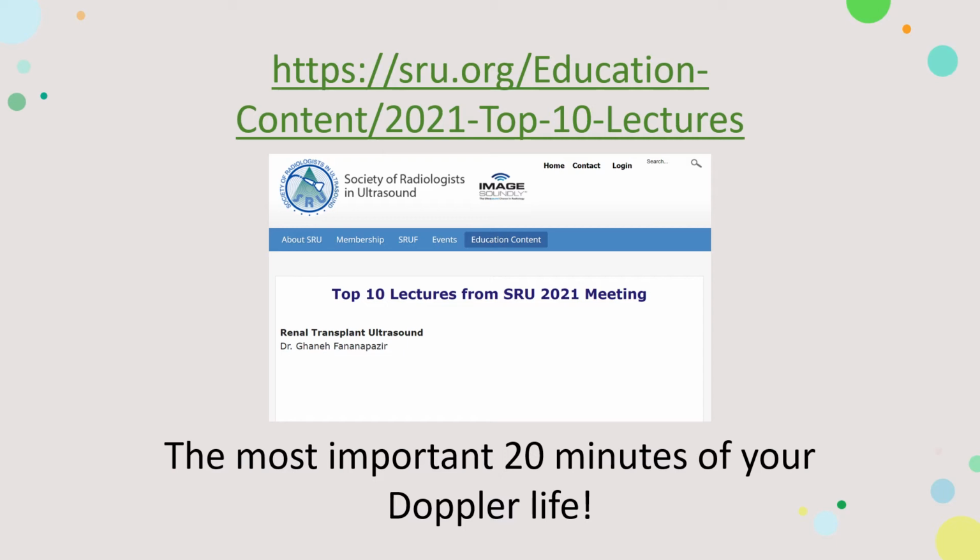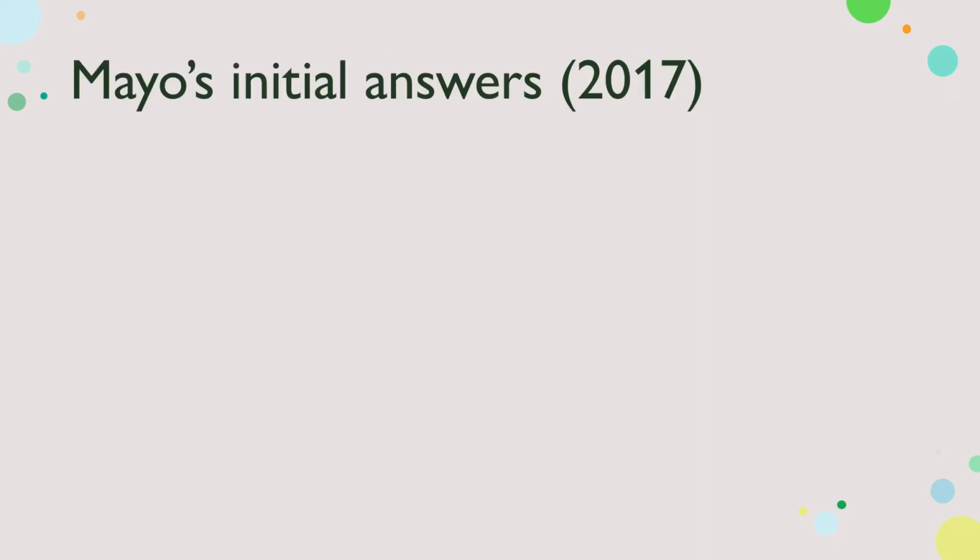It is the very first lecture in the top 10 lectures of SRU. It's definitely worth watching. I've summarized the things here, but his graphics and everything are so much prettier. He does it way better than I do.